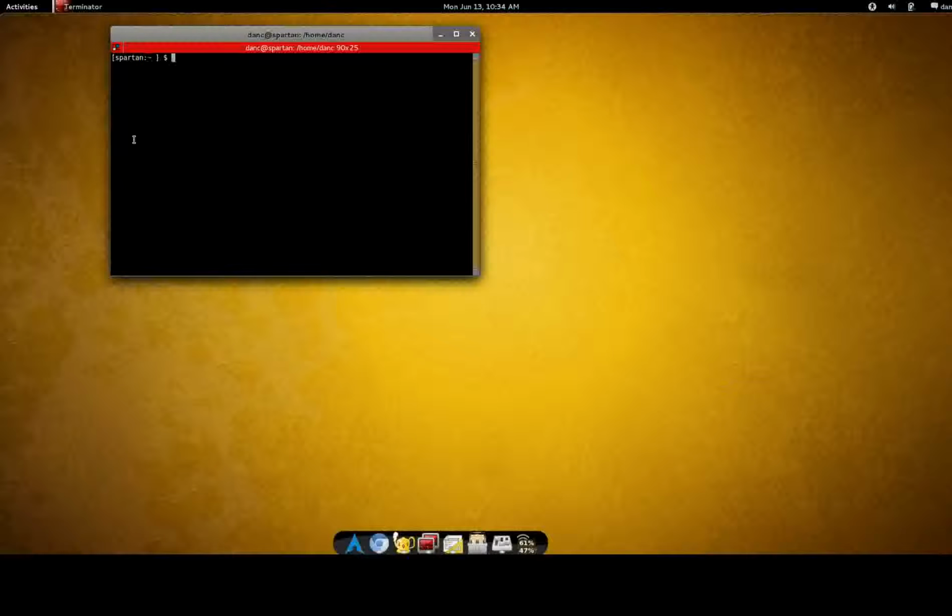Okay, this will be at least part one of this PyMEG GUI interface screencast. To get started, let's move into the directory where we downloaded and installed PyMEG, or at least downloaded. There's really no install at the moment. My path is as such, and I'm going to cd into the GUI GTK directory.